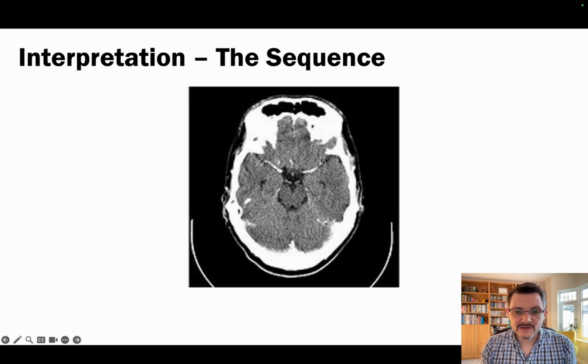Here we've got the middle cerebral artery on the left-hand side, and this is a contrasted scan. I didn't intend to get a CT that was contrast enhanced, but you can quite clearly see the middle cerebral artery here on the left and on the right. The CSF spaces here are appropriate and filled as you'd imagine. The skull is quite evident on the outside here, and you can see it nice and white and dense, and you can see this greyness here in the brain tissue.